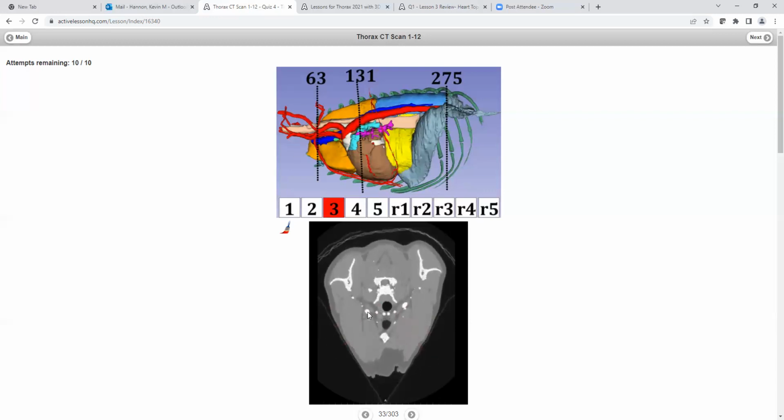And once it heads into the limb, it keeps going and some branches come off, and then it heads into the arm, and then it becomes the brachial. And that makes sense because this is the brachial artery. Now, here's our friend number 60. What is number 60? And we're up here at 15. So here again, you have to move. So it looks like it could be a number of things.